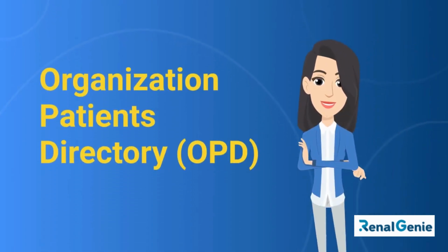This is a video about the Organization Patients Directory, or simply, OPD.